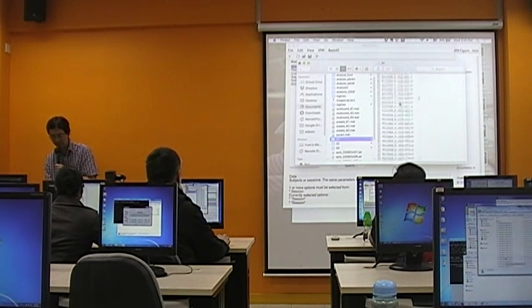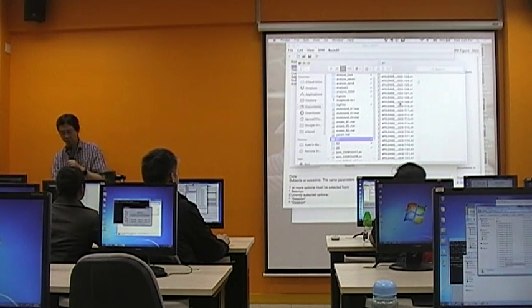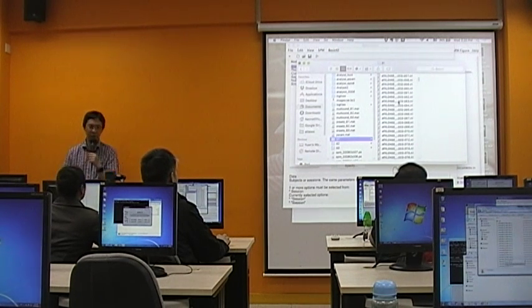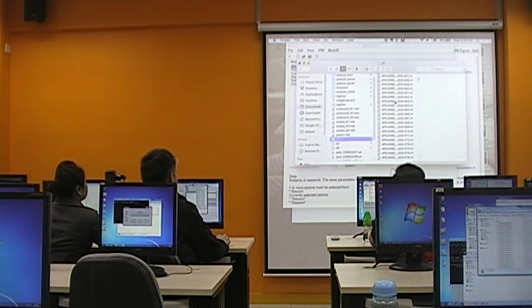So it's .nii, a NIfTI format. And each time you write out a new set of images, for a certain pre-processing step, you will add a prefix to the set of files so that you know exactly what you have done on your data. So here the files beginning with A, once again, are slice-time corrected images.